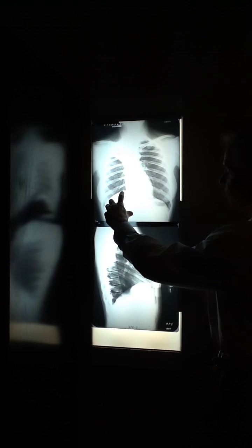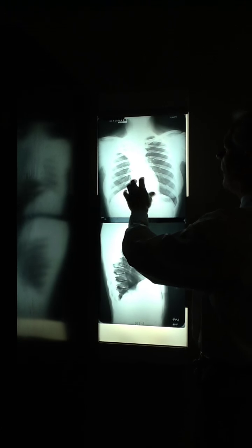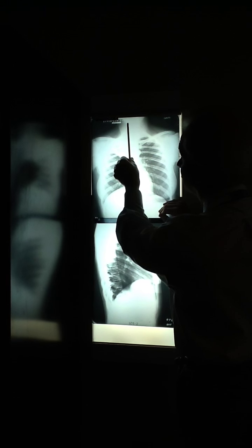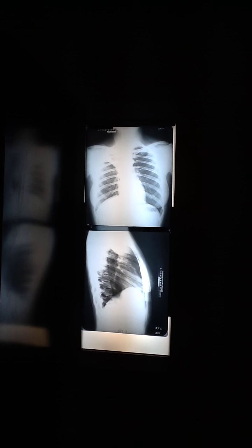And would you say this moved slightly? Yeah. Hilus, I don't think the hilus moved all that much. There may be a slight decrease in the rib interspaces. We can't see the trachea all that well. I'll bet the trachea is probably shifted slightly. But most of this seems to be overinflation and the diaphragm came up some. All the compensatory findings do not have to be there. There may only be one or two of them. They don't all have to be there.